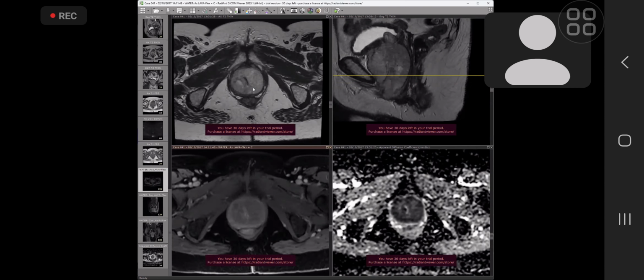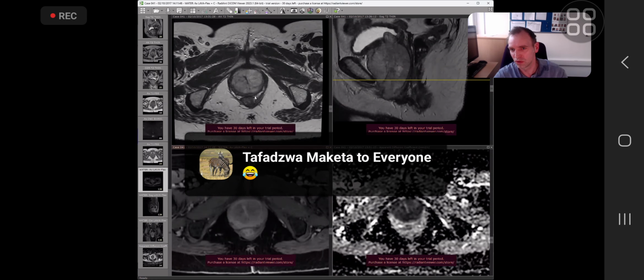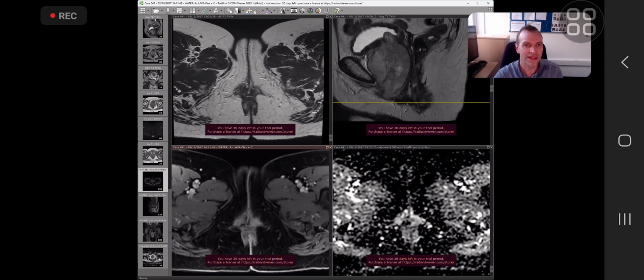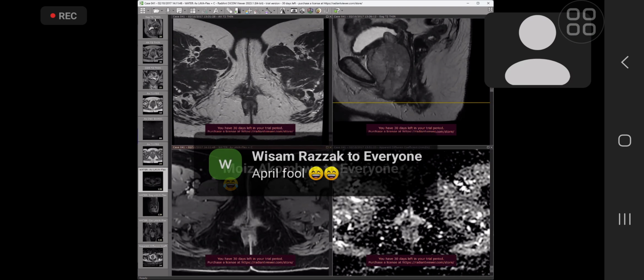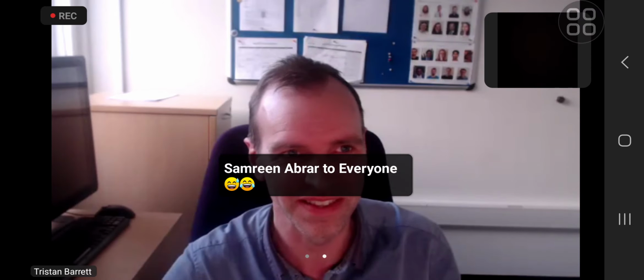So that's the only reason I'm showing that. It's incredible. It really does look like a prostate, but you can see that it's a female patient, and obviously there's no uterus, which doesn't help matters, but you have the axial imaging coming down here, you have the sagittal imaging. It's a very cruel way to end, but I apologize for that. I'll never forget that. You will never forget to think about that as well. That's another thing that sometimes these cases are useful for.